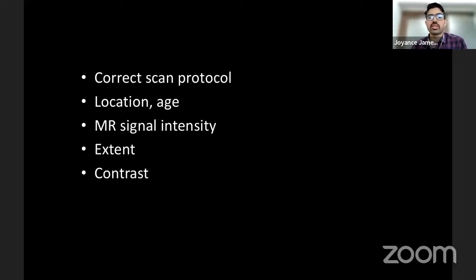First is, what are the MRI signs of malignant transformation of osteochondroma? So in osteochondroma, one is the thickness of the cartilage, which normally is less than 1.6 centimeter, but it's not absolute figures. Especially in children, in a growing skeleton, you may see a bit of heterogeneity within the osteochondroma itself. But the thickness, is it smooth or not? Is there any bone destruction and extraosseous soft tissue component?